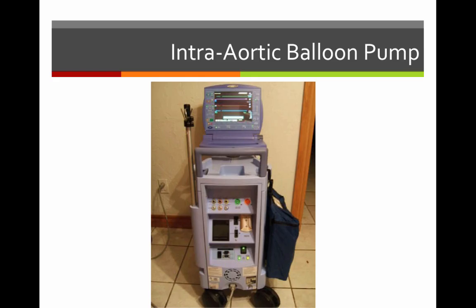This is the unit you're looking at right here. The entire unit has to be plugged into the wall. It's got a small battery on board, so basically it can move from the ICU down to your truck and then be plugged in down there as well. It's got a helium tank on board that inflates the balloon. And then that monitor right there will show you the waveforms that you need to see: balloon inflation pressure waveform, an EKG waveform, and an arterial line waveform.